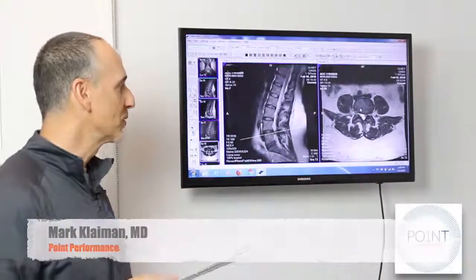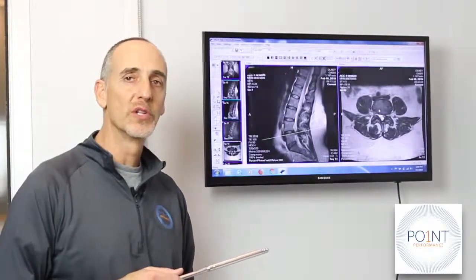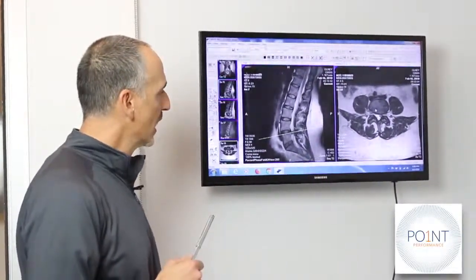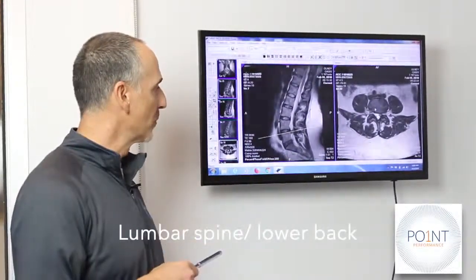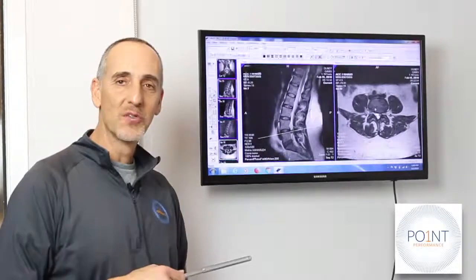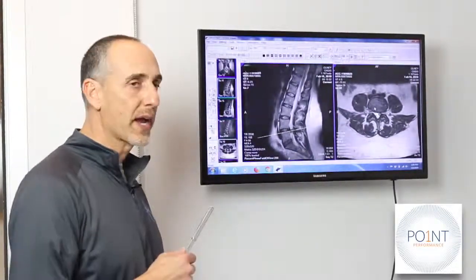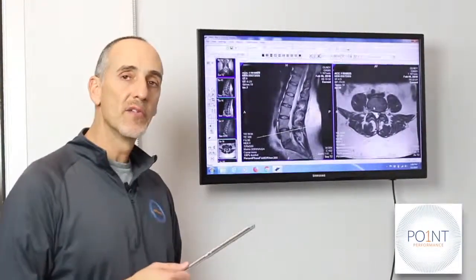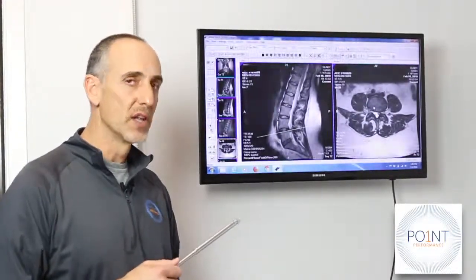I'd like to welcome you to the first video in a series of spine imaging videos that we're going to be doing for you. Today's example is one of the lumbar spine, or the lower back. I'd like to take you through some relevant anatomy, give you a bit of an anatomy lesson, show you what the lower back or the lumbar spine looks like on an MRI, and then give you an example of what kind of problem can exist in the lumbar spine.